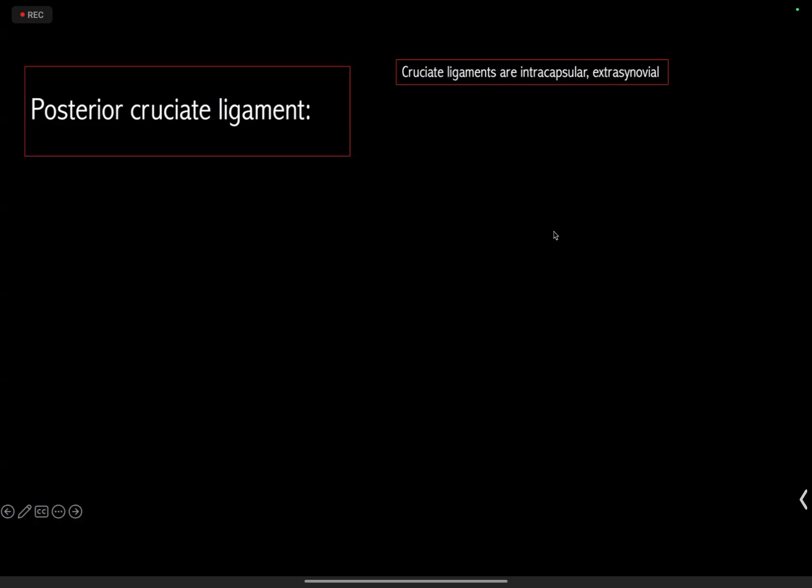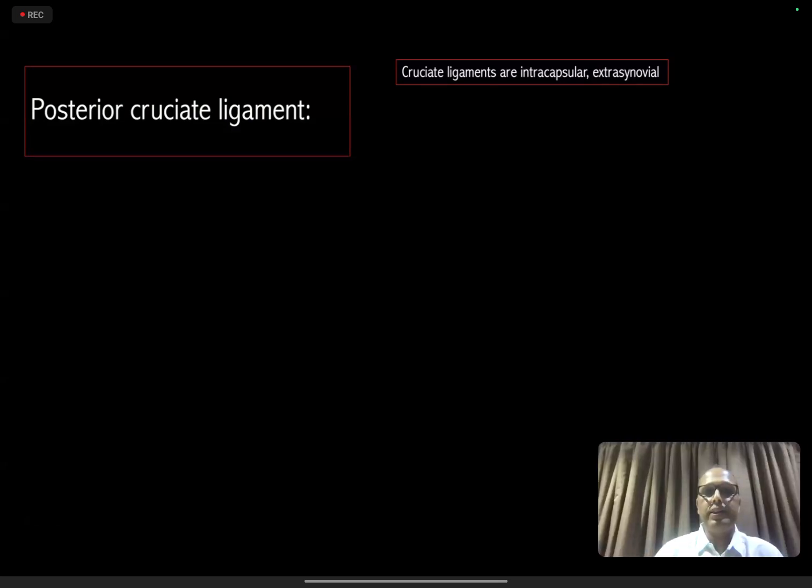Yes, that's right. The next question is: we often see degenerative changes in osteoarthritis, like in ACL. The ACL looks either attenuated, with some mucoid change. So how do we describe them in an OA knee? Primarily, there would be degenerative changes in the form of proliferation of the connective tissue and reduction in the functional fiber. So there would be a reduced ligament bulk.